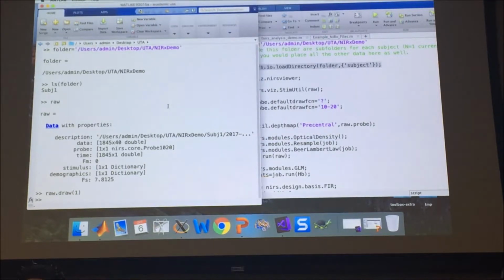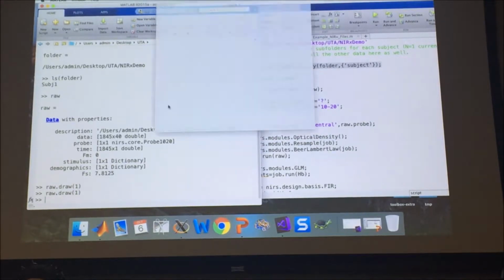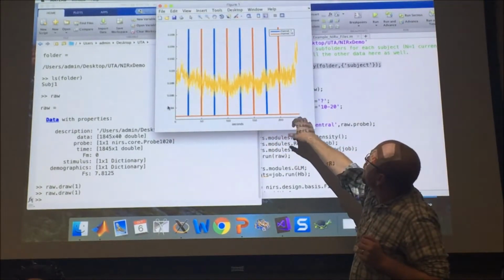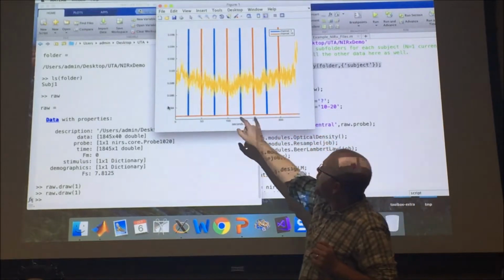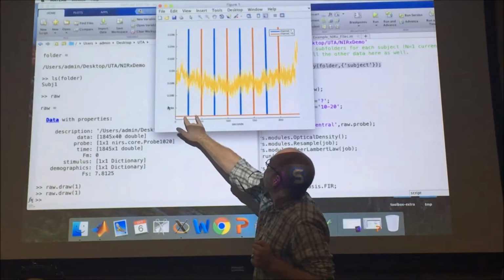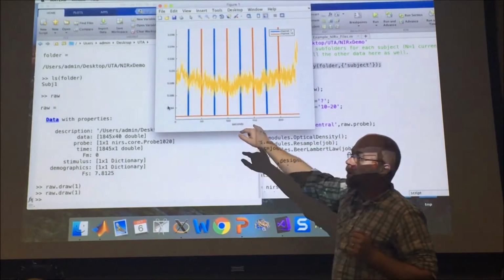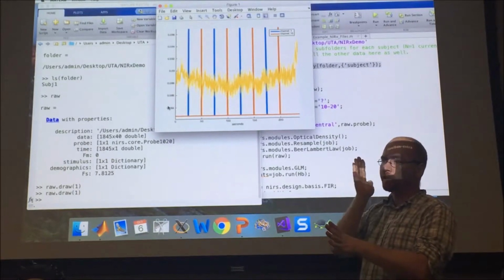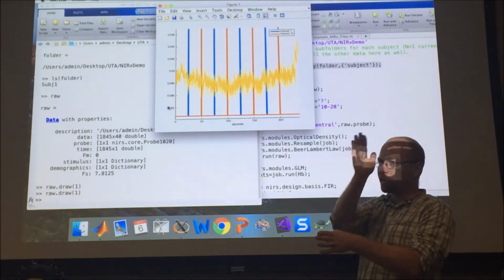And I'll show more of the graphical things for how to start managing this. So for this task, Thomas tapped his fingers for 10 seconds, right? So he's tapping left hand, right hand, left hand, right hand. But what was stored in the NIRStar data is just this delta function, this onset spike.